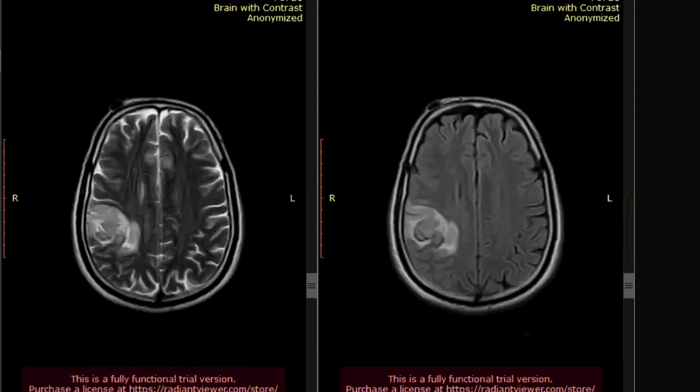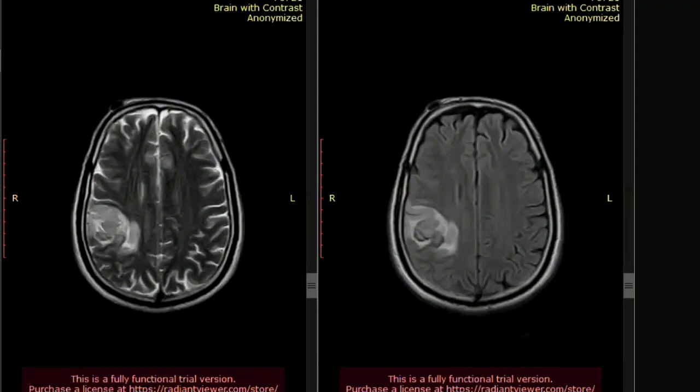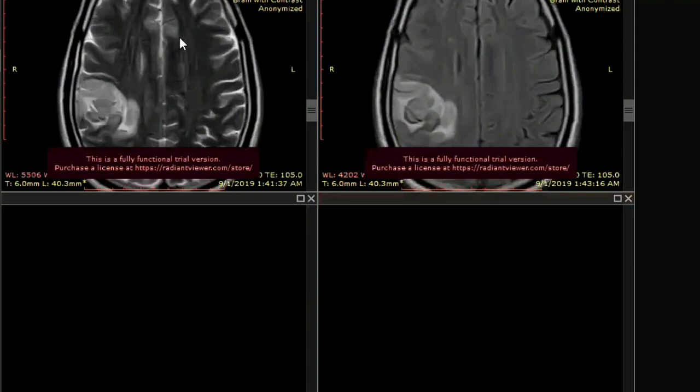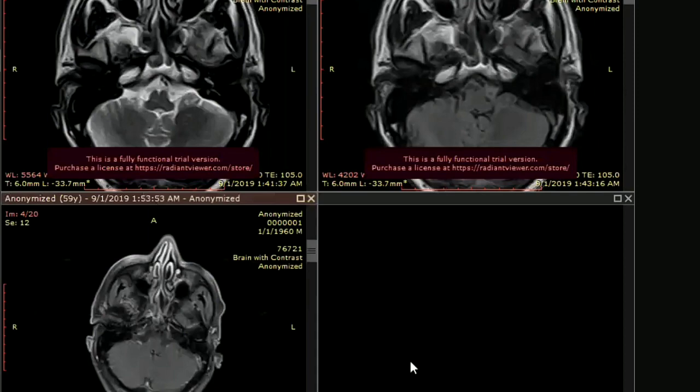Okay, ma'am, my topmost differential would be... Let me show you some selected images, right? Your description was nice. It is fine, because when you look at the selected images, then you will be able to find what it is.